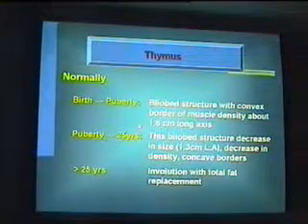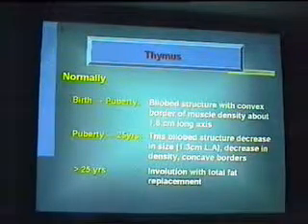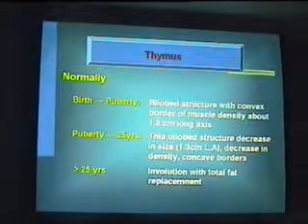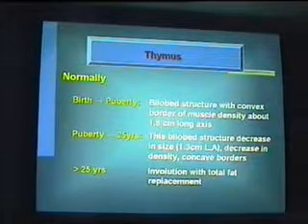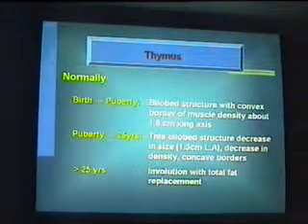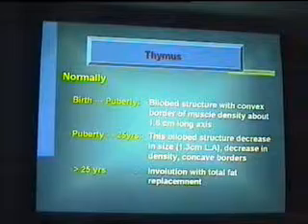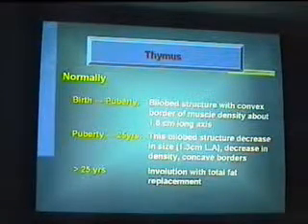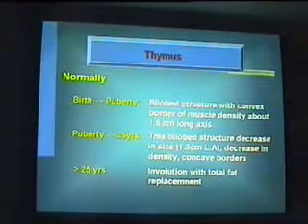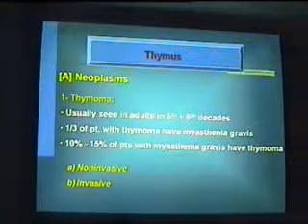لما نيجي بقى من البيوبرتي لسن 25 سنة تبتدي الثايمس تنكمش تدريجيا، فبدل ما طولها يبقى 1.8 يعني nearly 2 centimeters هتبقى تقريبا 1 سنتيمتر or 1.3. بدل الكونفكس اوتر بوردر هتبتدي تبقى كونكيف، and الاتنيويشن فاليو بدل ما هي muscle density تبتدي الاتنيويشن فاليو to decrease, and this decrease is due to fat deposition. بيحصل fat deposition prior to complete atrophy of this thymus. خلاص؟ بعد سن ال 25 الفات deposition بيزيد لما تبقى totally replaced by fat. اوكي؟ وتدوب في الميديستاينال فات، النورمال ميديستاينال فات. Fine? Fine.